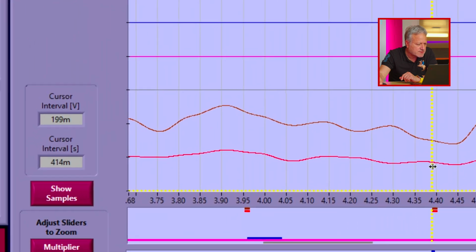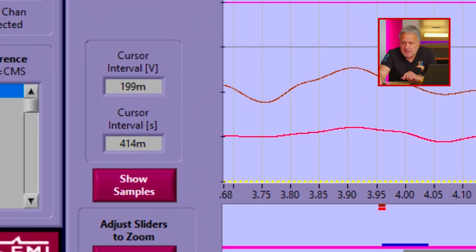It was 400 milliseconds, okay? But that has nothing to do with the outcome of this file, because remember, Joanna was doing a Jenga, and so we didn't actually use any triggers. I just embedded those to show you that we can collect 8 bits, 255 markers, in an EEG and the light NIRS file merged together. So the triggers are there. You can do any paradigm that you can think of, because we have 8 bits.